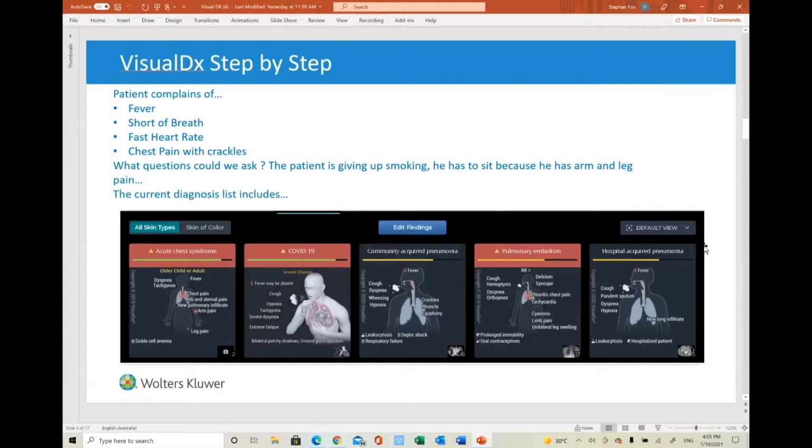We can see across the screen for this tab, which is the observations across all of the diagnoses, that we can see different sorts of diagnoses which are possible. We can see in this case, these ones are sympticons. They are summaries of symptoms for this particular patient.